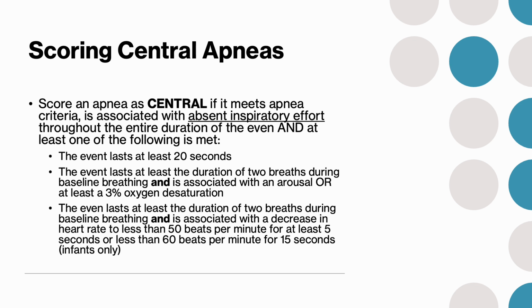Central apneas are scored a little differently. There must still be the 90% or greater signal amplitude loss, but the effort belts must also lose their effort. You want 3 flat lines, 4 if you include the nasal pressure transducer. The duration is different than obstruction.